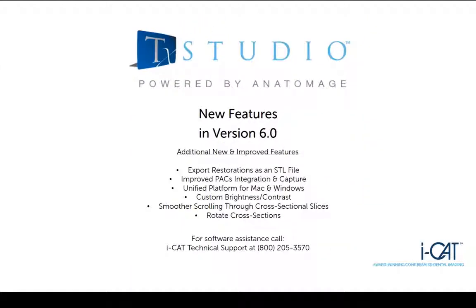Additional to those features already shown, TxSTUDIO offers other new and improved features. The software now allows for the export of restorations as an STL file. There's an improved PACS integration and easier capture file saving functions. TxSTUDIO 6 is based on a new multi-platform code to offer more consistent Mac and Windows versions.